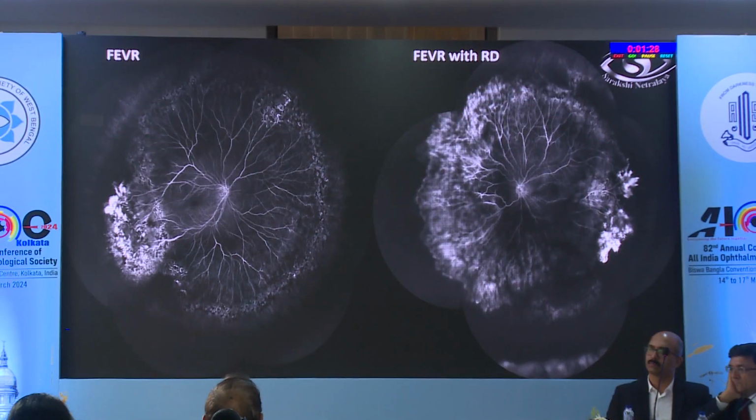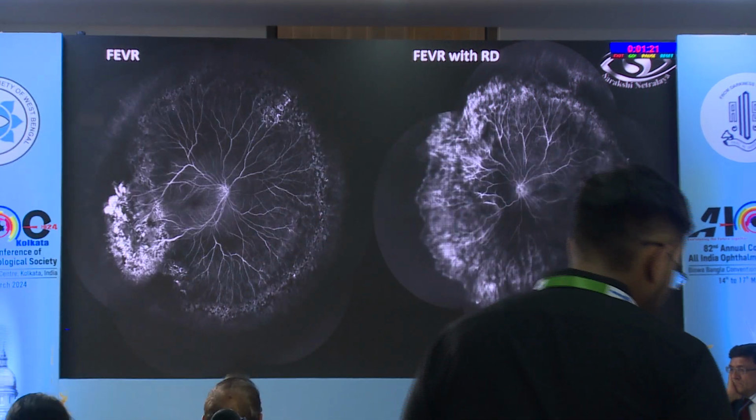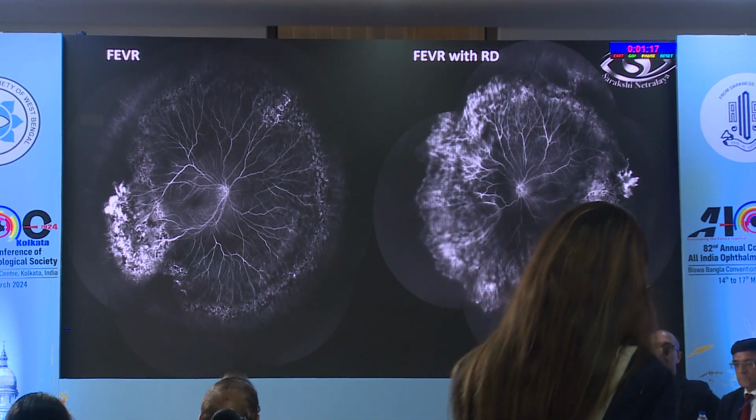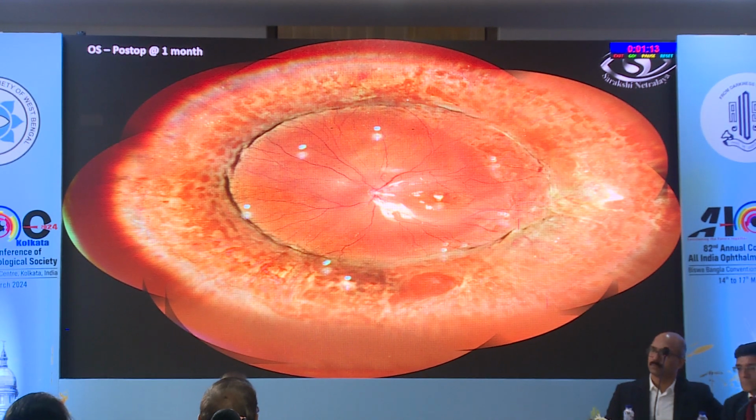And this is a case where we could do a Widefield angiogram, without which it is not possible to pick up this disease. So importantly, we treated the better asymptomatic eye with a laser and averted a disaster which had already happened in the left eye. Of course, we operated the left eye, and this is the post-op photograph of the same patient.